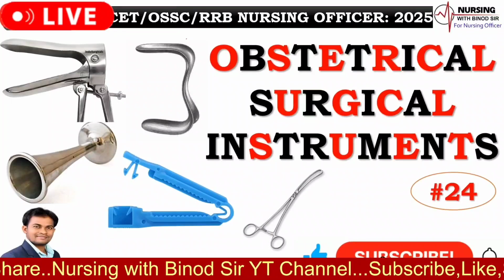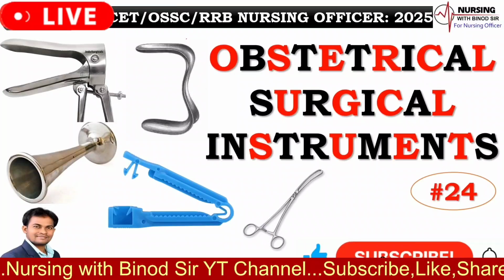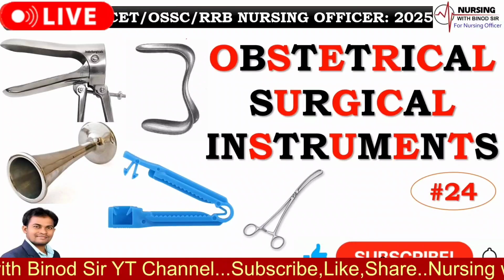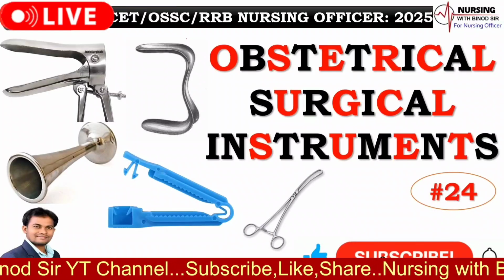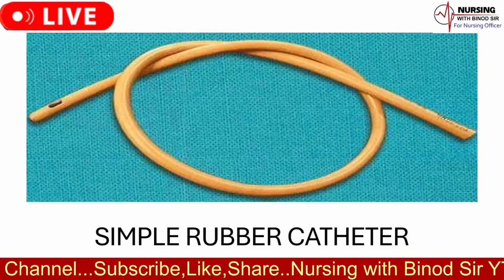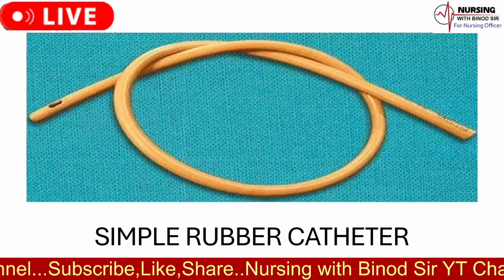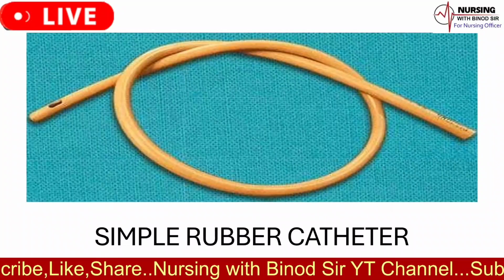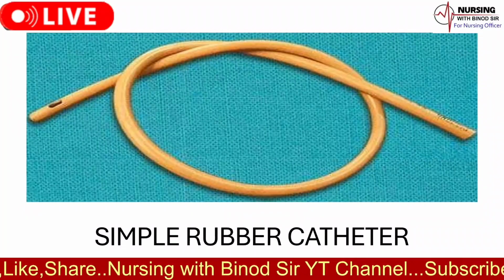Today we will discuss the obstetric surgical instruments. In this video, you will learn the names of the instruments and their uses. The name of the catheter is simple rubber catheter. Simple rubber catheter is used to empty the bladder in cases with retention of urine.